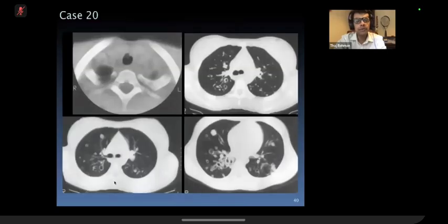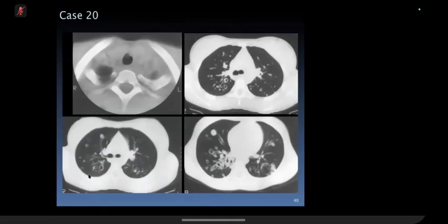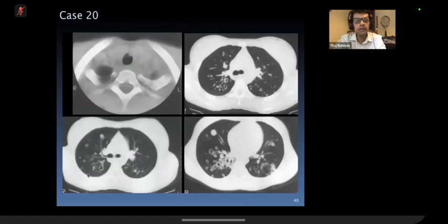This is a very tricky one, so I'll just give you the diagnosis straight away. You can see in the trachea, there is an endoluminal soft tissue nodule. So this is tracheal and laryngeal papillomatosis, which manifests as multiple lung cysts as well as nodules in the trachea and larynx. You may get a case like this in the long case. So remember to keep this in mind.